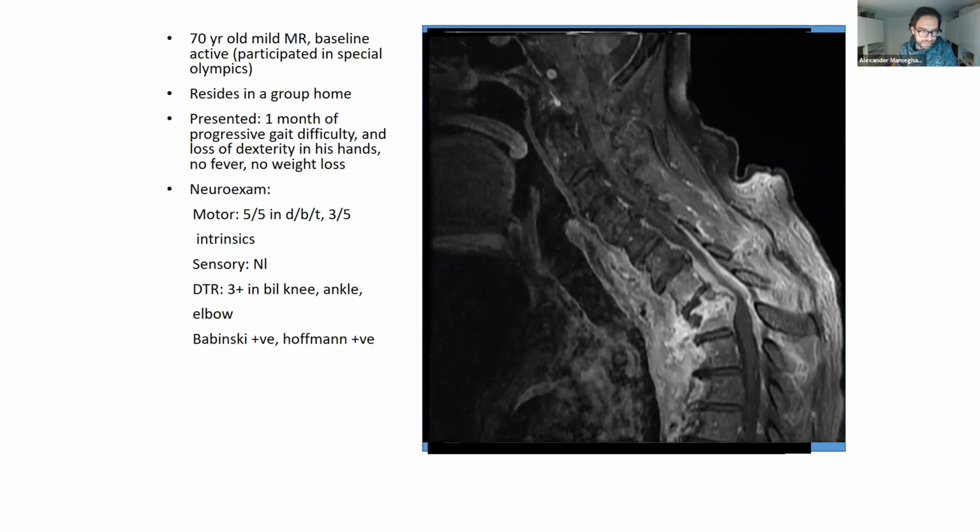Is there a complete vertebral body missing when you count? So this is C7, this is T1, and that's T2. So the disc is missing here, T1 and T2. There seems to be a lot of contrast anteriorly without any big, huge abscess.